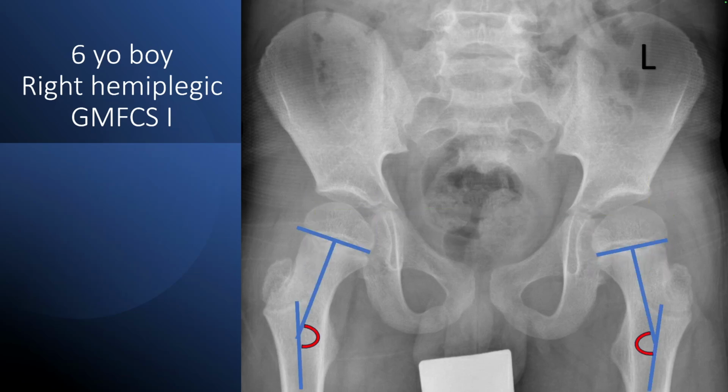Virtually the only finding on this radiograph to suggest this patient has CP is the appearance of mild valgus, as measured by the head shaft angle. However, in this patient, this may actually be projectional artifact, due to the fact that there is femoral anteversion and the hips have been slightly externally rotated, as suggested by the more prominent lesser trochanters and the appearance of the greater trochanters, particularly on the patient's left side.